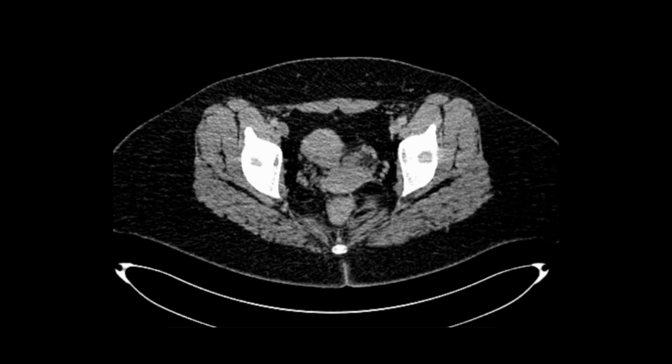As you all know by now, this is an axial CT scan, and we will start from the pelvis and go above, and I will just show a technique of how I trace the colon on console, and then we will re-emphasize the need of viewing the scan on console with your radiologist when we discuss a few cases of colon cancer.